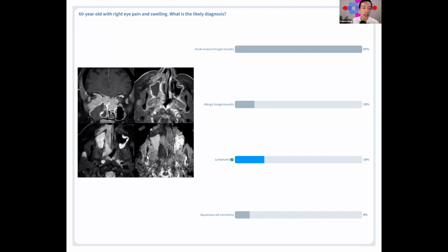So this patient had a prior history of sinonasal surgery, because this image is actually taken from the time of a disease recurrence for them. They've had prior sinonasal surgery, so inferior turbinate resection, so that I'm not showing you a black turbinate here. And the other question was, does high diffusivity mean the opposite of diffusion restriction? Yes, so high diffusivity means high diffusion, which means the opposite of diffusion restriction, which is low diffusion. And the last question is, can you please review the necrotizing otitis externa case?